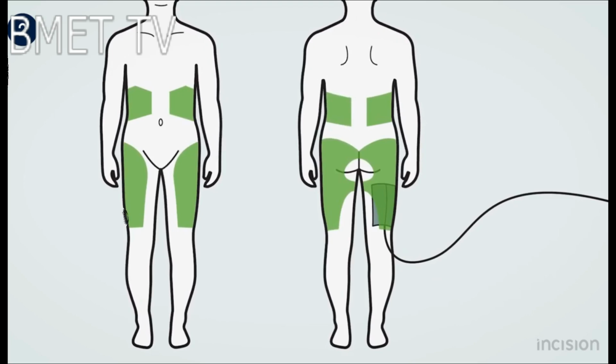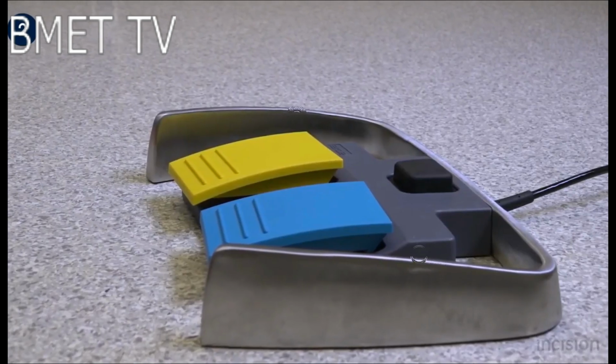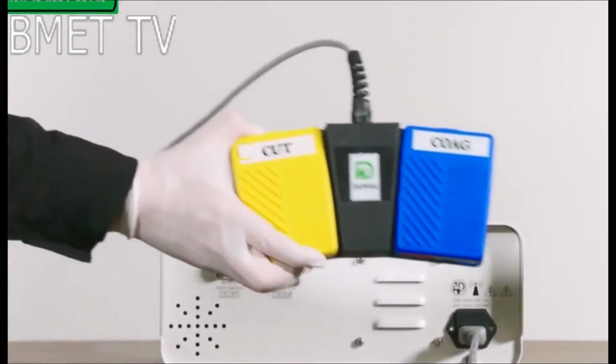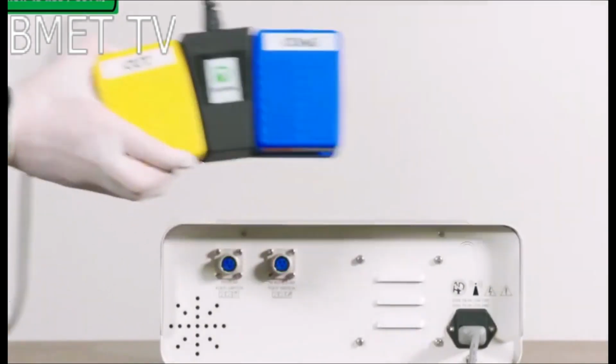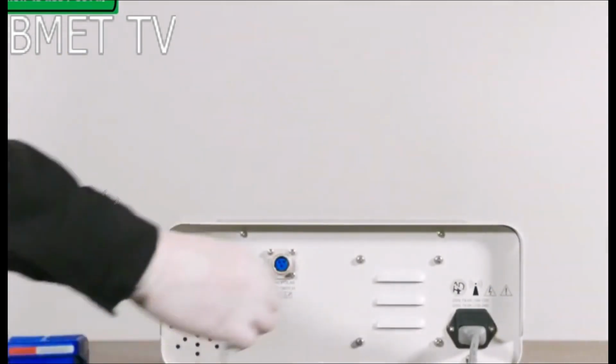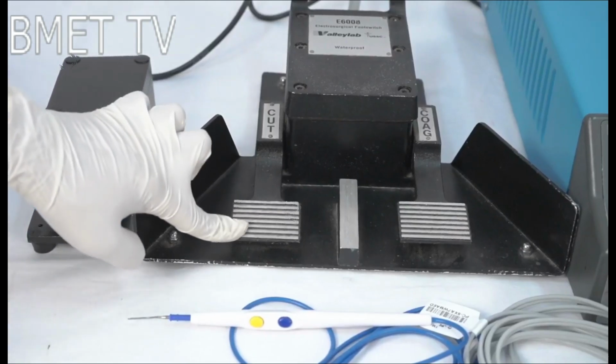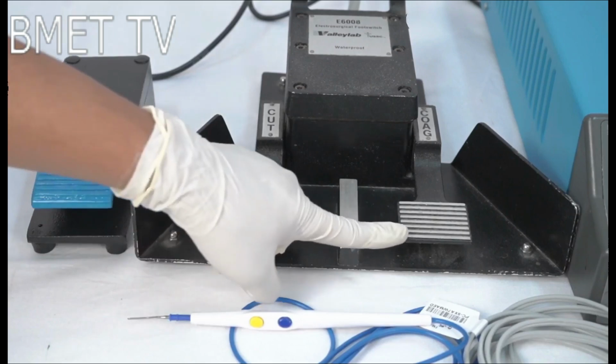An electric foot switch works like any other electric switch. Inside the foot switch, there are contact points. The wires of the foot switch are connected to the electric circuit of a device. When wired normally open, the contacts within the foot switch are not touching. The electric circuit is not connected and the device is off. When the foot switch is compressed, the contacts will be closed, connecting the electric circuit and switching the machine on.